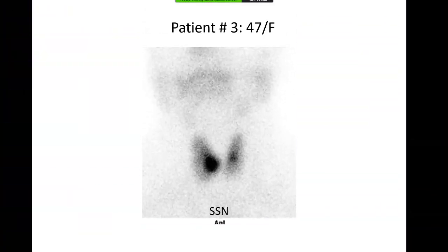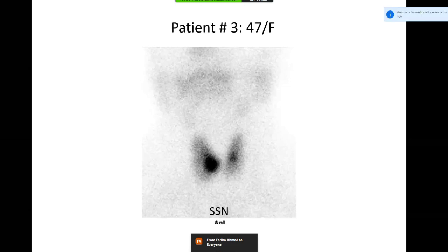This is a thyroid scan in which I can see that there is increased radiotracer uptake in the region of the right lobe of thyroid in the form of a nodule, and another area of focal increased uptake in the left lobe. However, the remaining thyroid gland also shows a slight uptake. These imaging findings are in favor of multiple nodules, multinodular goiter. Yep. So this would be multinodular goiter, or as somebody has written, Plummer's disease.